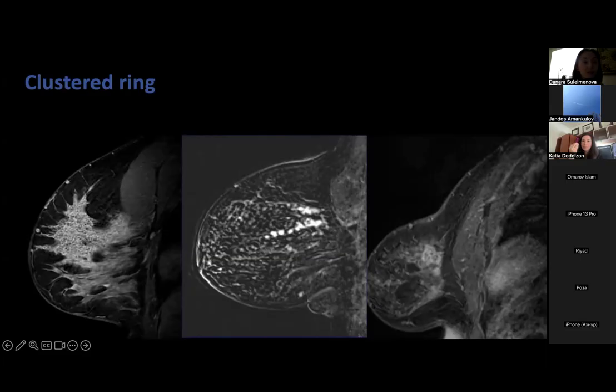That's the abnormal diseased duct, and it's the periductal tissue that actually is enhancing. This is classic for ductal carcinoma in situ. This is a BI-RADS 5. This warrants a biopsy. Almost looks like a little string of pearls here. So when you see this, very suspicious.